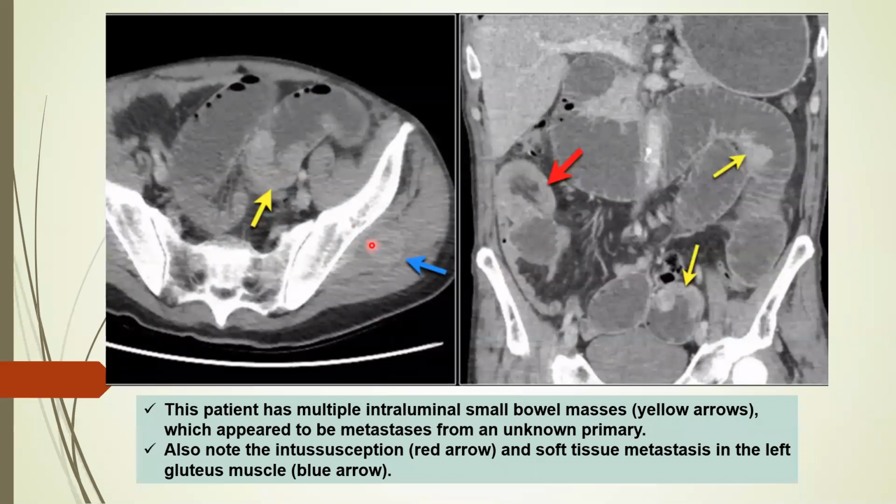This is a case of a small bowel metastasis with unknown primary. Also presented with multifocal small bowel masses.